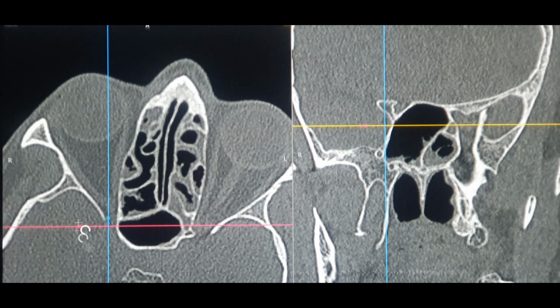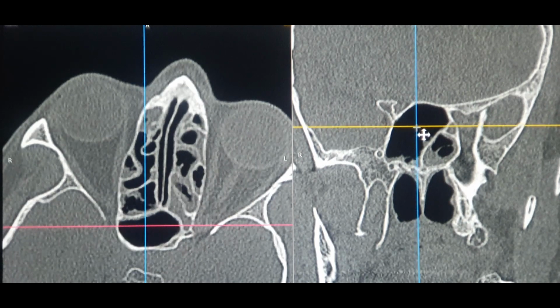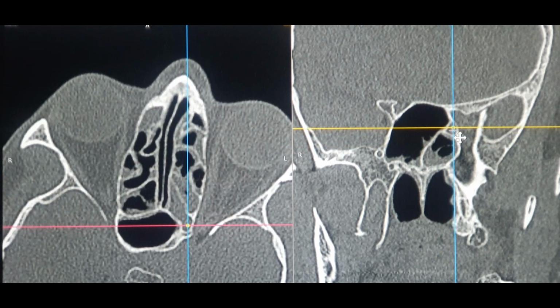So I think now so far the anatomy of the axial section is much more clear for you guys. This being here the sphenoid sinus, the dominant right side, and if I can show you the left sphenoid, you can have the left sphenoid right here. Now this patient is having an Onodi cell on the left aspect. So if I can show you the cursor here, now that's basically an Onodi cell, which is nothing but a posterior ethmoidal cell compressing on the sphenoid. And on the axial scan, you can actually see that the right sphenoid is so dominant and the left sphenoid over here is so compressed. Because of the Onodi cell in presence, it is actually compressing the left sphenoid as well.